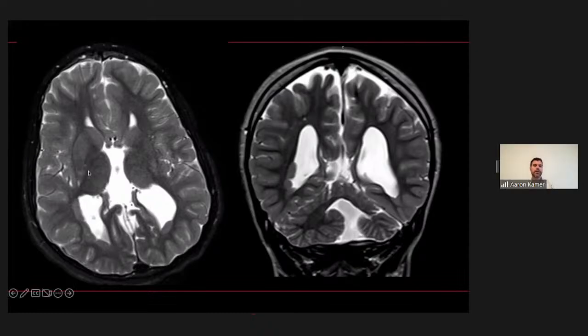And I love that you were talking about all these other malformations first, because this is a great example of a case where there's so much going on that I've seen in the past, many gray matter heterotopia cases get lost and not described. The heterotopia is not described because of everything else that's going on in the brain, and it's a subtle abnormality in a lot of our cases. So you definitely found it, but your eye was drawn to a lot of other places because there's a lot going on in this patient.